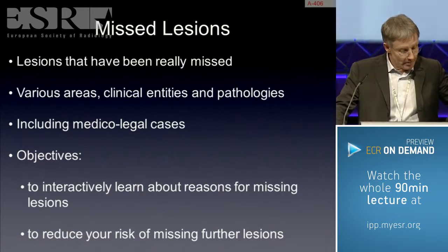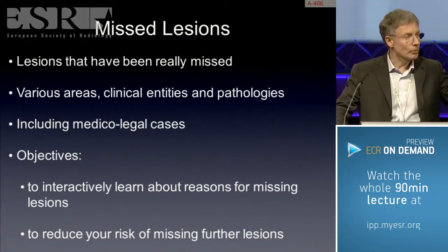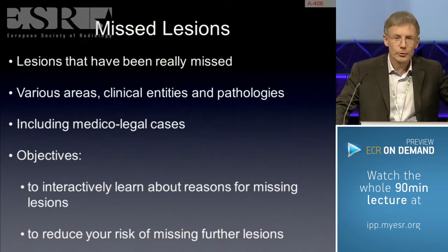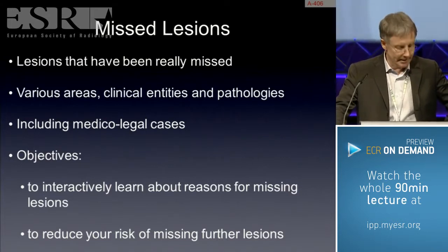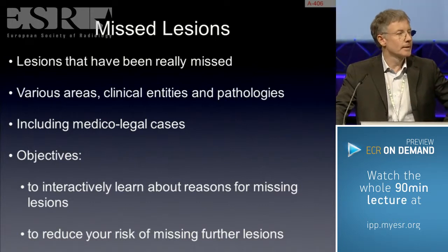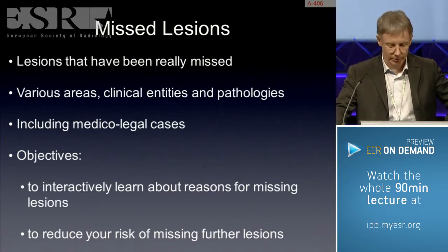And I'll just remind you, of course, that the chest X-ray is very important for the management of patients with chest diseases and is still one of the most frequent causes of malpractice issues. So this afternoon, we will show you 33 cases with 29 questions. And we've tested these cases on clean fourth-year medical students who score an average of 50%. So you can compare your performance with those of these medical students.